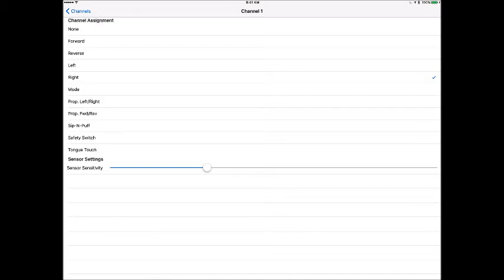What's nice about that, instead of using, at times we'll plug in a switch to the reset or the mode port and use it as a stop switch. This one right here effectively just stops the signal from our device to the chair.